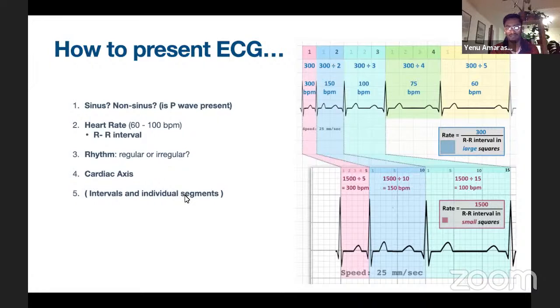In most cases, you don't necessarily have to do it, because if it presents as physiological, it's okay. And as this is a basic lecture, in most cases, it will be physiological. And one thing I should point out here is before you present it and just before you start analyzing the ECG, like I mentioned before, what you should do is always check the speed.